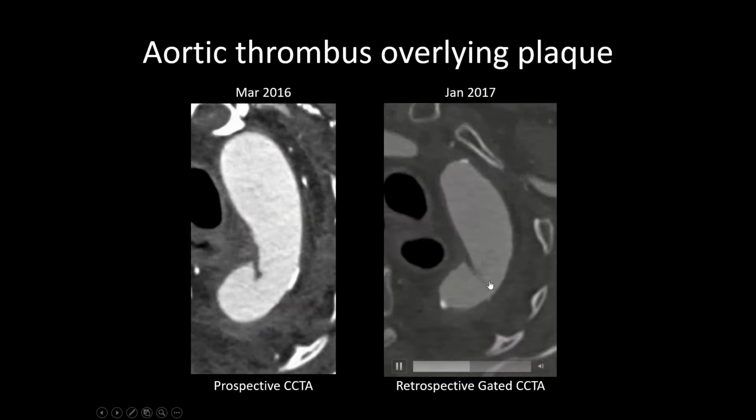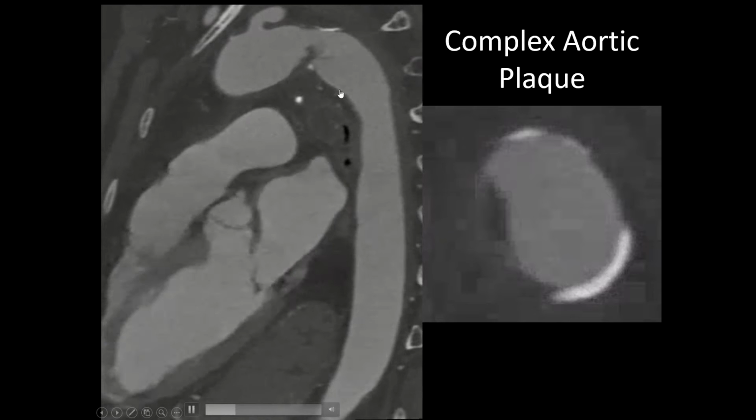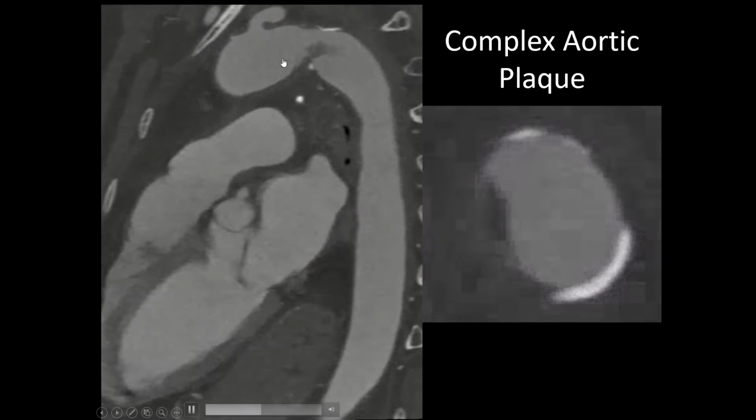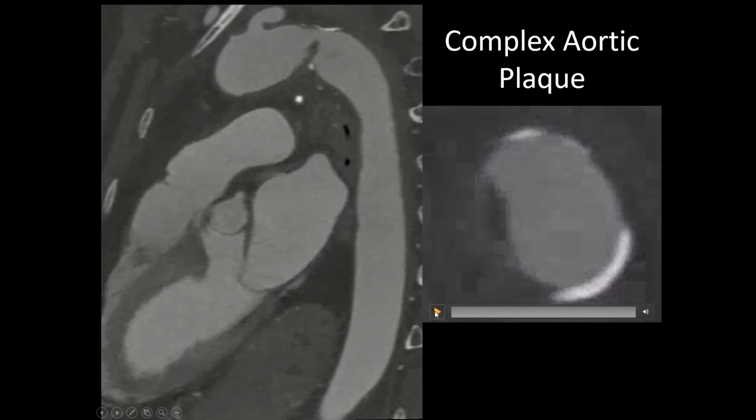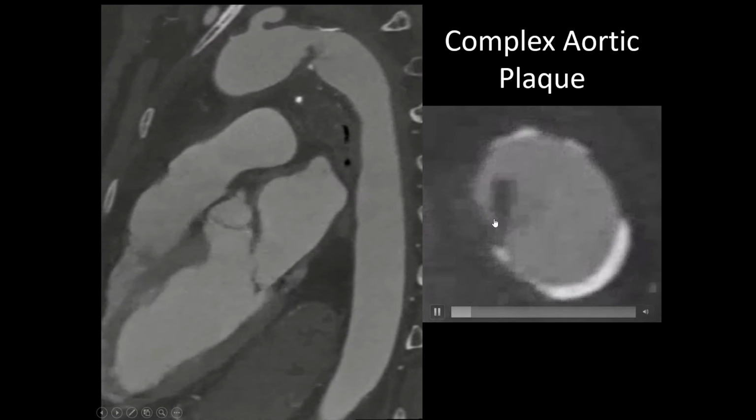Here again is the same lesion from before and the CCTA we did later on, which shows us motion, and you can see it clearly, very nicely, much more so than the MRI, how it's just moving around in the lumen. And here's another angle, you can see it just move right there. And this you already saw, so you can see them move from the different views.